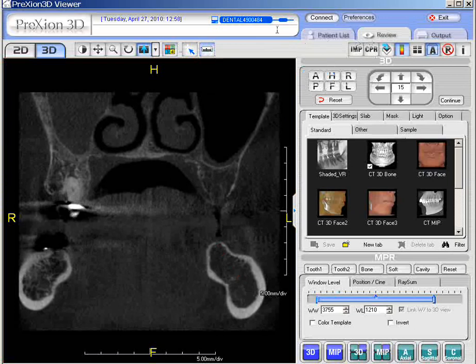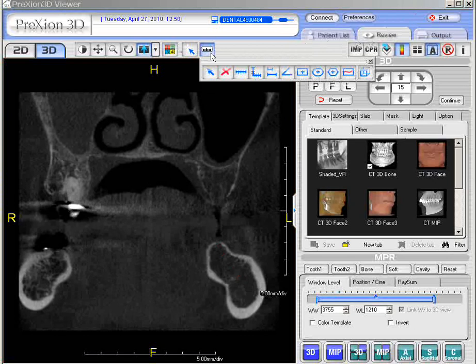And once again, we're going to left click it, open the toolbox, and go now to this feature called line segment. Line segment is if you want to measure apart from different sections.